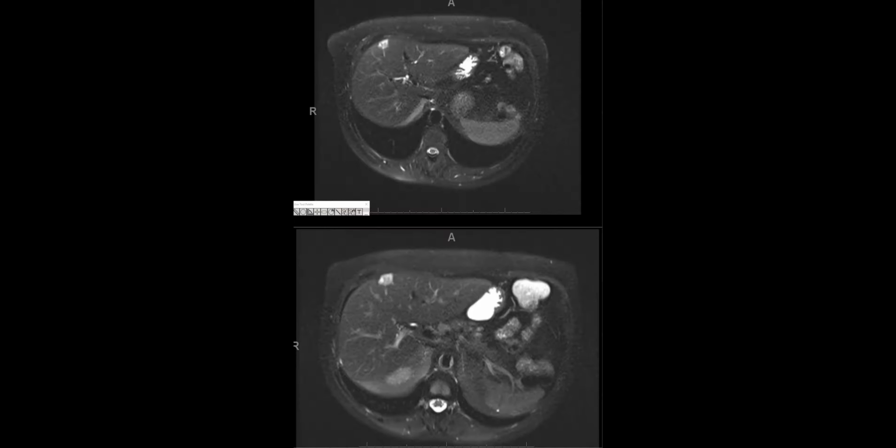And I'm thinking, well, it's probably something benign. Let me look back to see what this thing was. So I'm going to go back to, let's see, this is 15, no. Yeah, about 15 years earlier. Whoops, wrong one. About 15 years earlier.